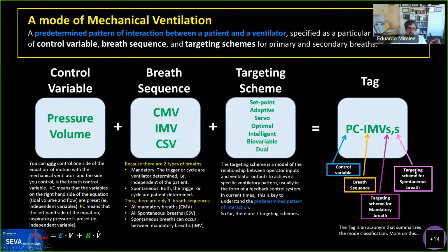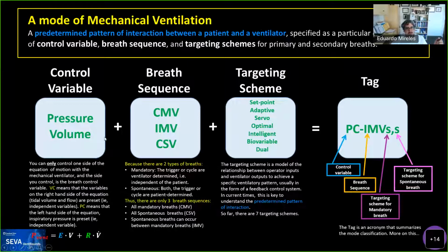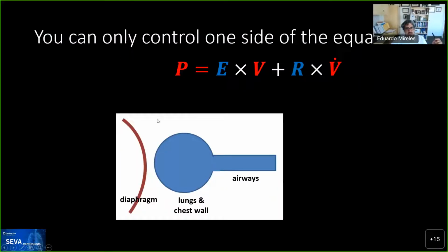And actually, your eyes should always be going towards the flow waveform. That's actually the easiest way to recognize this. And you're most likely to see features on that waveform of flow control, which is a geometric shape. So either a square waveform or a descending waveform. Although there are some other modes that can control and generate different waveforms, this is the easiest tell.